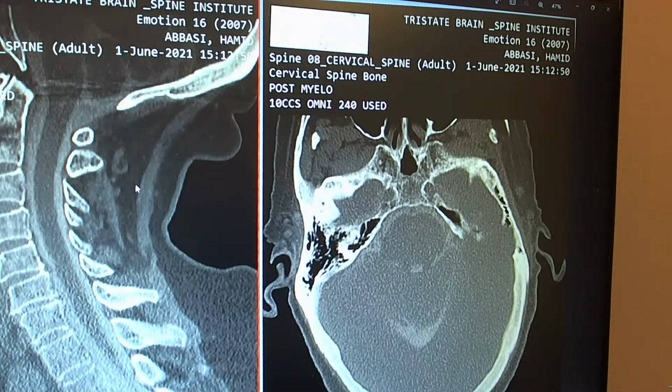This is the so-called nuchal muscle. Are you familiar with what the nuchal muscle is? I don't know how you pronounce it in English. In German, we call it the nuchal muscle or nuchal ligament, which practically connects the cervical spine to the occipital bone. Yes, perfect. Okay, let's go to the next one. Obviously, you would see the ears here.